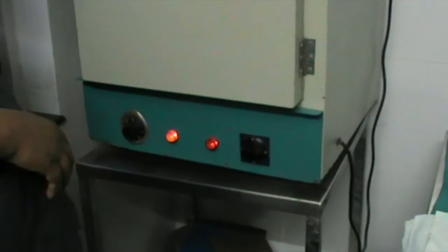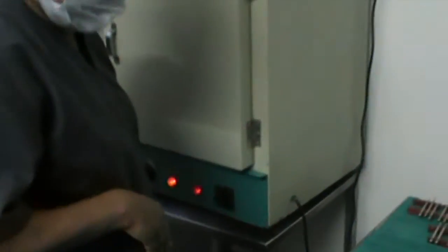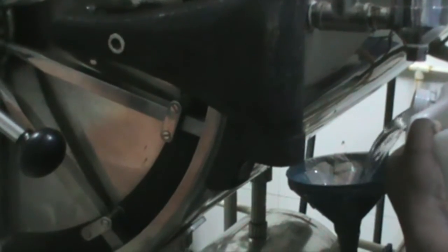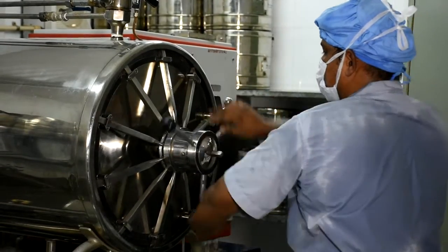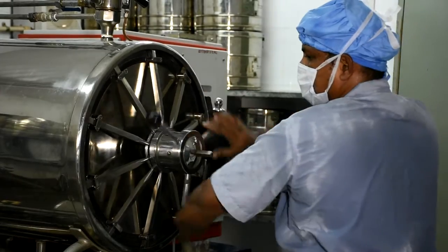Hot air oven. Dry heat sterilization can be used for powders, oils, creams, all glass articles, and sharp instruments. Use distilled water only for autoclave machines. One should not underestimate the need to run the cycle completely. It is the holding time at the required temperature and pressure that is important and not the total cycle time.